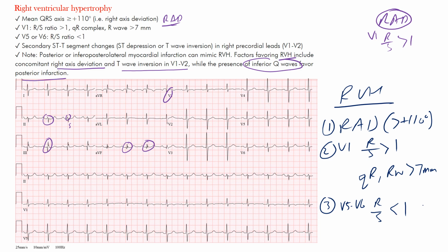And then obviously you can look at the ST segment changes. Make sure you also differentiate this from a posterior infarct, which may also present with similar findings. Remember, in V1 and V2, where we tend to see Q waves in maybe a septal infarct, in the opposite, reciprocal changes in the posterior leads we would now see these big R waves, okay? So these are R waves or Q waves in a posterior infarct, so you don't want to confuse those.